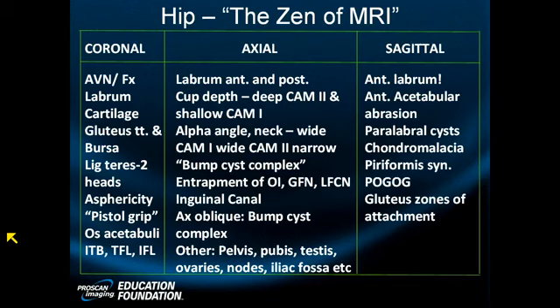Let's look at this one. Whoops, sorry. Trying to blow it up. At first glance, it doesn't look very onerous. It has a little conical top to it. As we go up, it gets a little deeper, doesn't it? It gets more razor-like, more thin, but it's contiguous. As we go down, it gets pretty deep, but it's the up part that's more disconcerting. Let's turn our attention to another projection, because I don't think we can be confident enough yet that this is indeed a labral tear related to impingement.